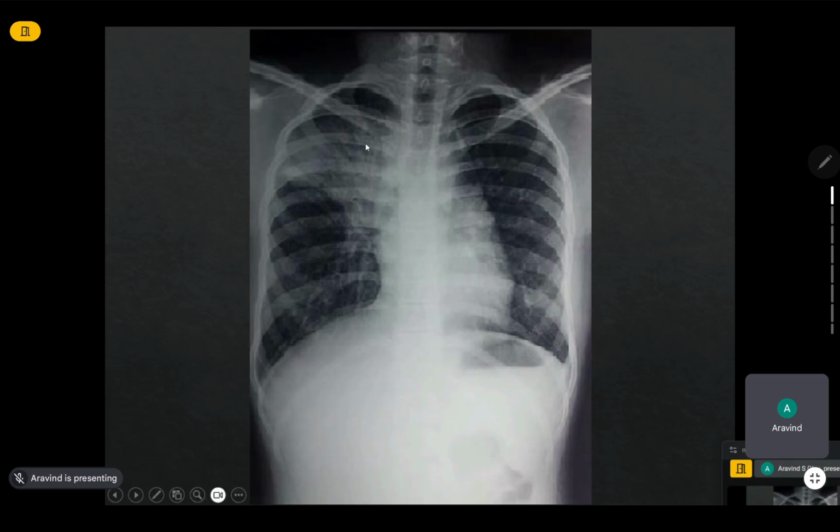What is this? Right-sided upper zone. Pleural effusion? Lymph node, lung hilar, collapse. Okay. Is it homogeneous? No, it is not homogeneous. And you could see some blackish things inside, black streaks inside. Reticular nodular. Consolidation of the upper zone. Yes, it is consolidation.